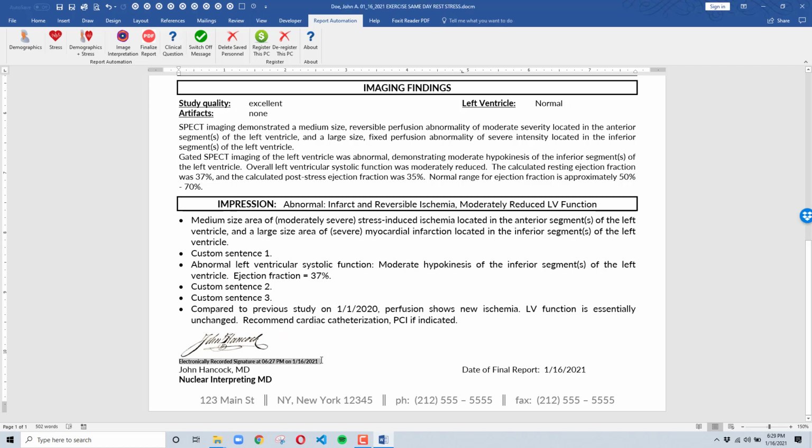So we still have the signature because we had generated this report previously. This time date stamp is a little outdated now, so if you just go up to the top here and hit this little clock where it says insert signature date time and just click on that, it'll get updated. In this case, just the time. So that's really about it.